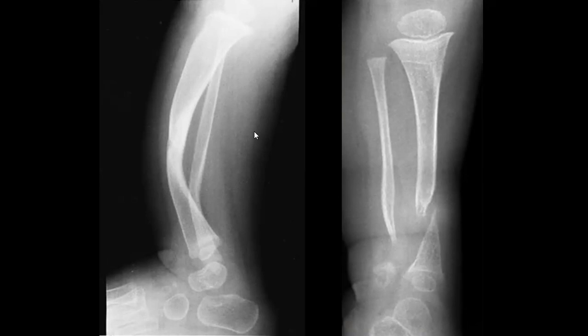Perfect. Pseudoarthrosis, nice. And the, yes, Sarah, okay, perfect. And what else? The bowing, perfect. So the anterior bowing, one of the good differentials to put neurofibromatosis type 1, and the bowing, yes, also anterior bowing, perfect.